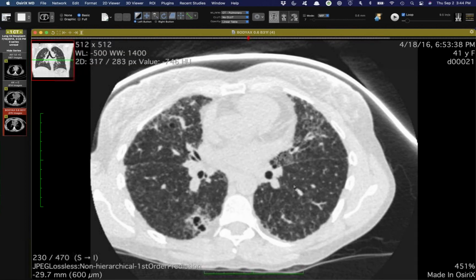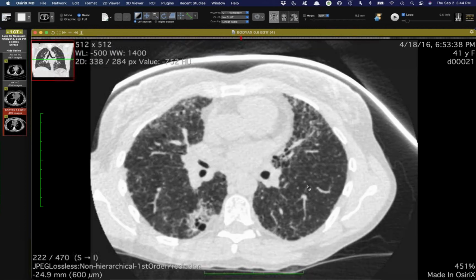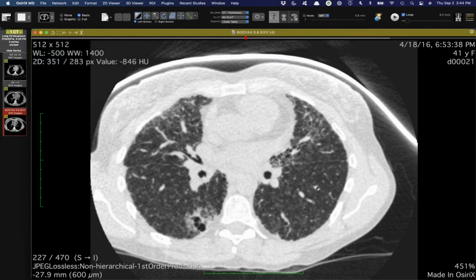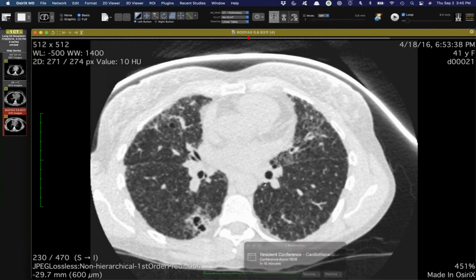But this is a look that we see in a substantial minority of familial cases, just of unclassifiable fibrosis like this. What did you call the acceleration? Genetic anticipation. I like it. So in succeeding generations, it occurs earlier. And as Jeff said, that's typical of telomere shortening mutations.